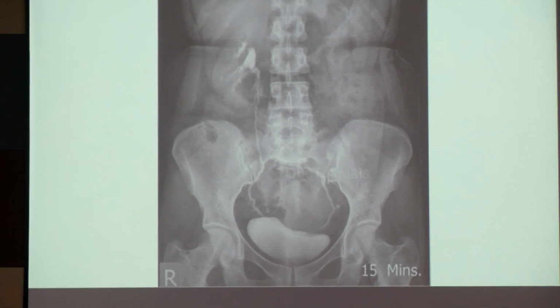Something called ectopic kidneys. Ectopic kidneys are actually at the level of the pelvis, which is the most common thing. So don't just hurriedly say, sir, there is no kidney out there. It might be a nephrectomy, it might be a renal agenesis. No, you have to see the entire length, and then judge. Suppose this is not there at all, sir, I still want more plates to confirm my diagnosis.